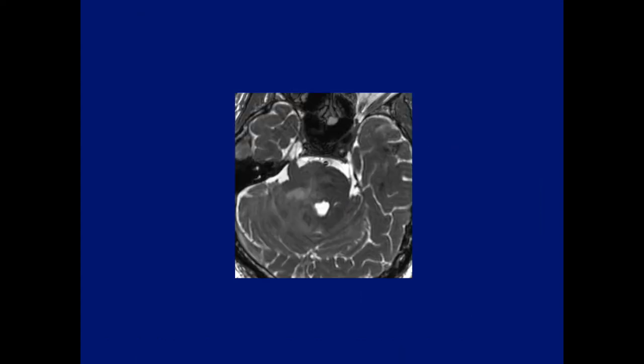Okay, what is the abnormality here? What's involved? Anybody? Correct.